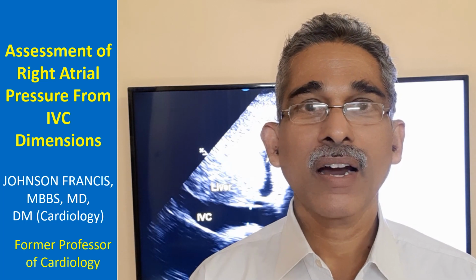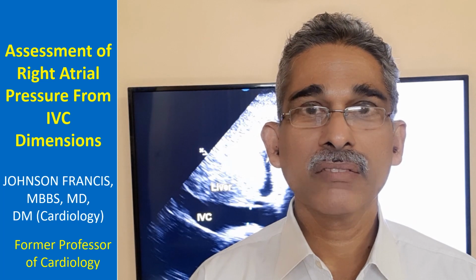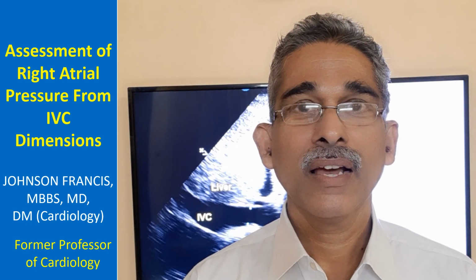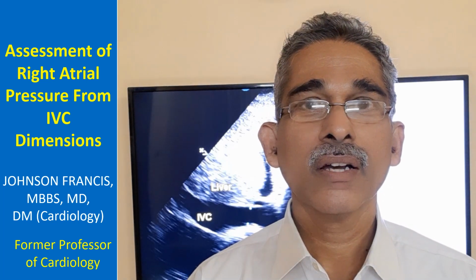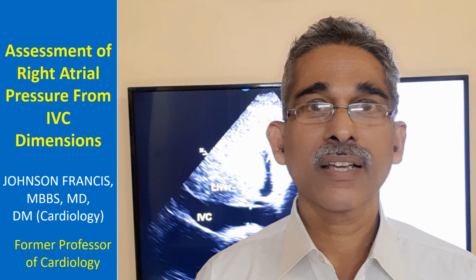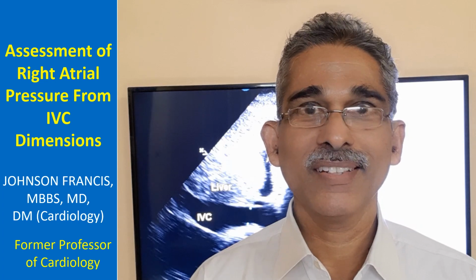On the other hand, when the IVC is enlarged, or rather plethoric, then you know right atrial pressure is high, and even if there is hypotension, you cannot give much fluid to such a case. So this is the importance of assessing IVC, which we will see in a little more detail.